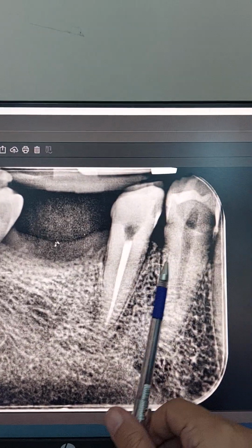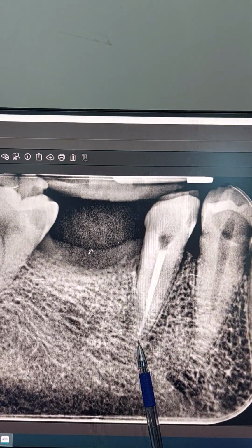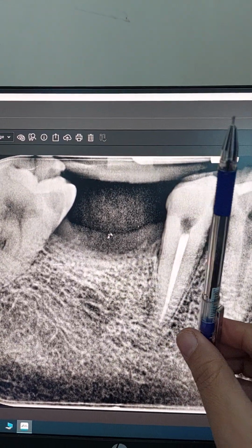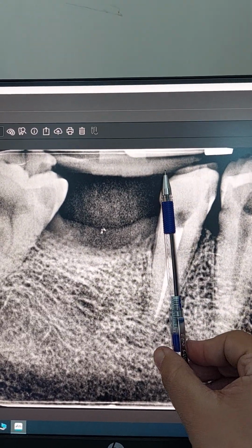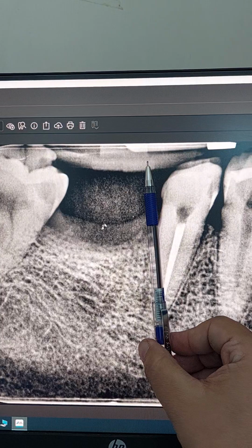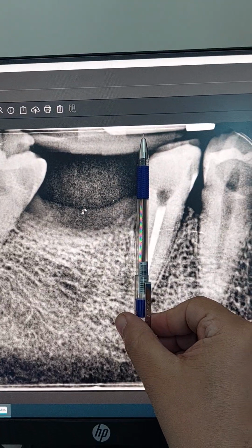They are spaced. I think, doctor, that the occlusal forces on them were high, since there is no space here. Yes, we can see here. See the roots? Yes. Okay, so the roots are tilted, and this is usually what we see in an old extraction, it would be going like this. But because of the occlusal force, it tipped mesially once more. Yes. But usually when we have an early extraction, the 5 goes distally, toward the empty side. The empty side, but it depends on the occlusal stop. So it shifted it here, but this was its original position.